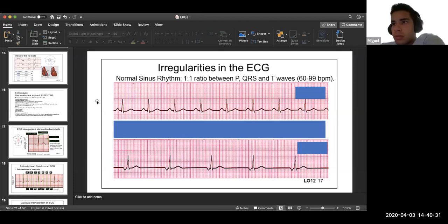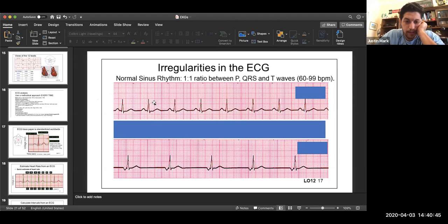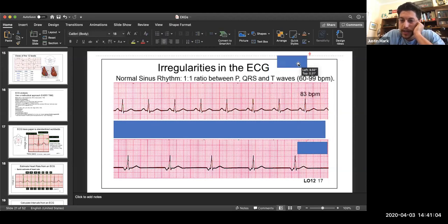About 50. How do you get 50? Maybe about 85. Okay. Well, better. Yeah. So if I'm starting here, give or take. So one. Oh, I did the bottom one. My bad. Oh yeah, we're doing the top one. Yeah. We're doing the normal first. So this right here, right? So we count 1, 2, 3, about 4. Okay. So about 75. Here they tell you it's 83. Someone said 85. That's really good. But there really is no difference between 75, 83, and 85.